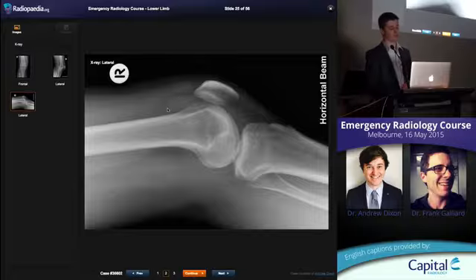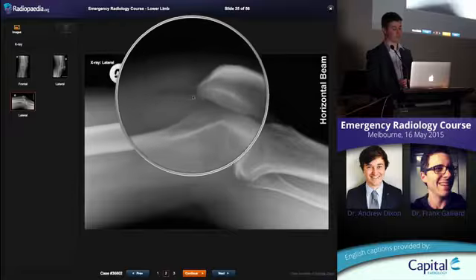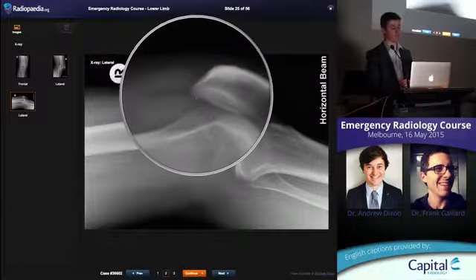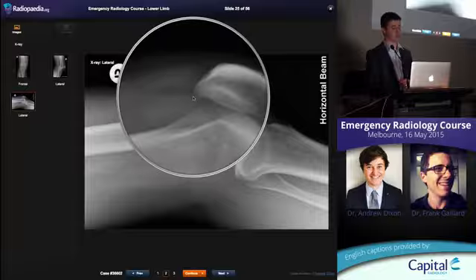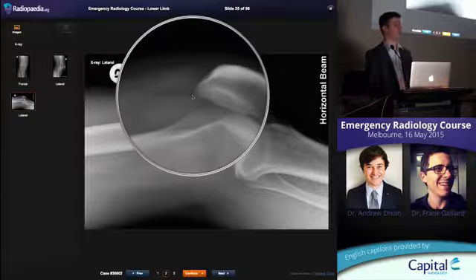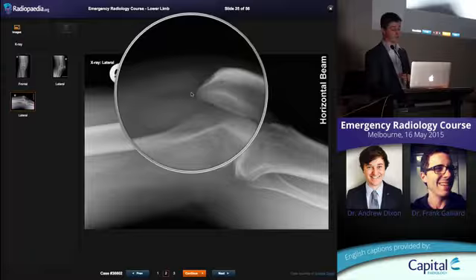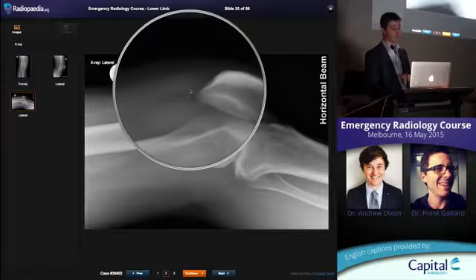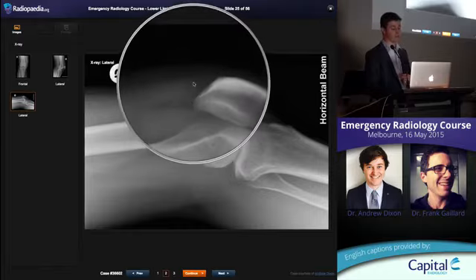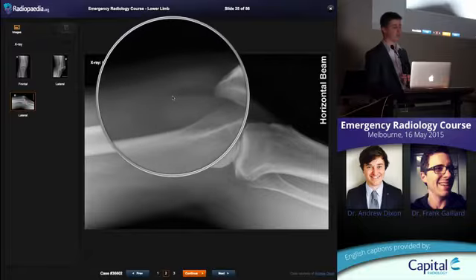And what you're looking for is, in this case, you've got a joint effusion, a nice rounded bit of stuff sitting up here, tilting the patella forward. What you're looking for is this perfectly horizontal line, which we saw in the shoulder, a lipohemarthrosis. I think it does project all right, but that is the quadriceps fat pad. See that little triangle there, slightly different density? Quadriceps fat pad, patella tendon, and then this little extra bit of fat here with a perfectly straight line.